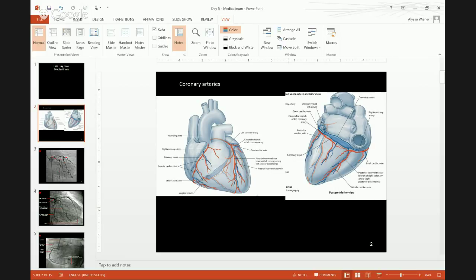In terms of what is next, 2 would be next. Here we see the kind of splitting off of the trachea, and we're just starting to see a lot more of the vessels at the top of the heart, but we haven't seen the full heart body yet. 3 is the most caudal. We see this big, big honking heart, okay?